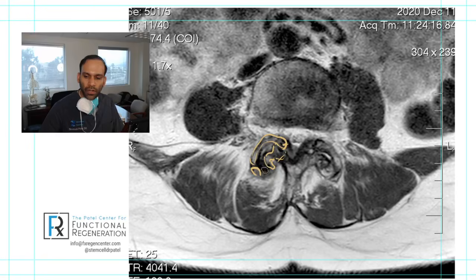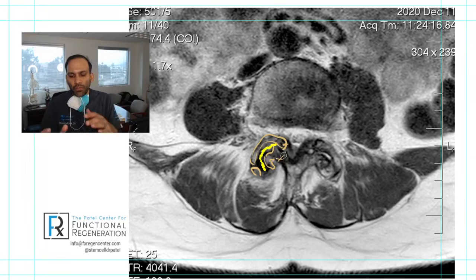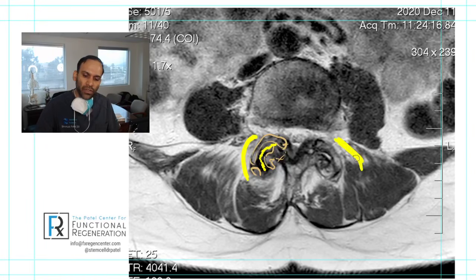This is where your hamburger meat is, essentially, and the joint is not only looking like it's smushed, but you could see how the orientation of the joint has changed. This orientation of the joint is more in this direction now, versus this orientation is more in this direction.